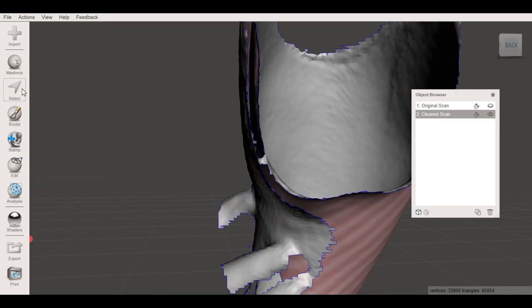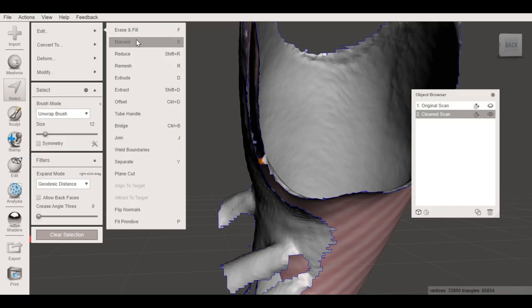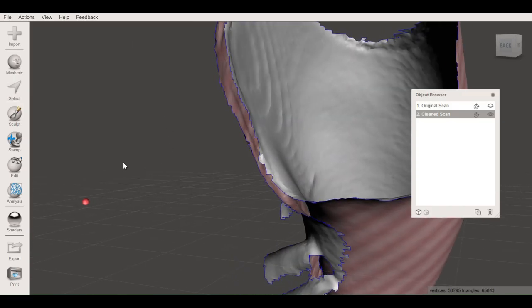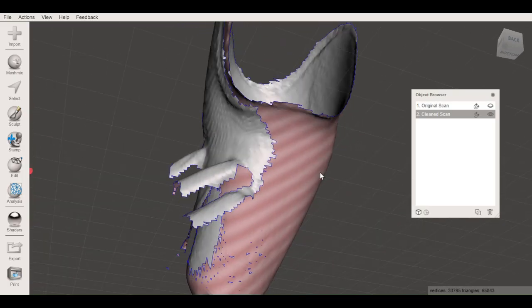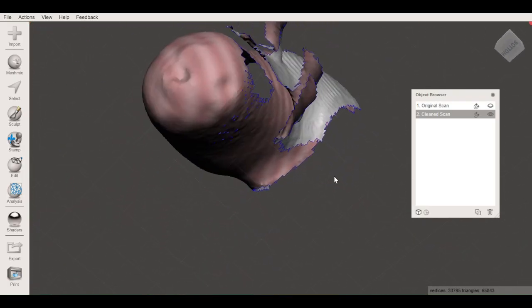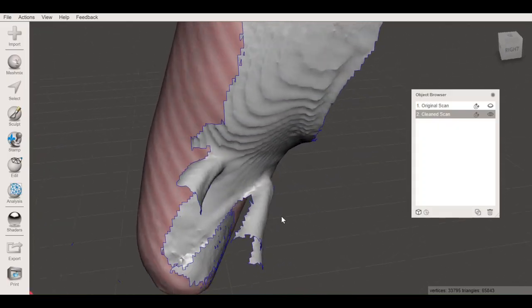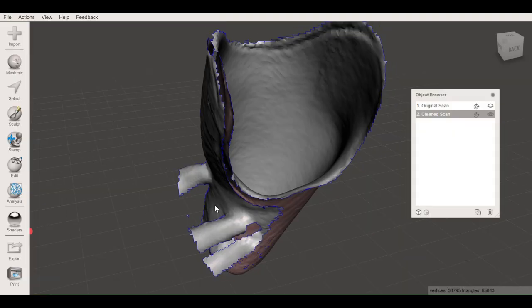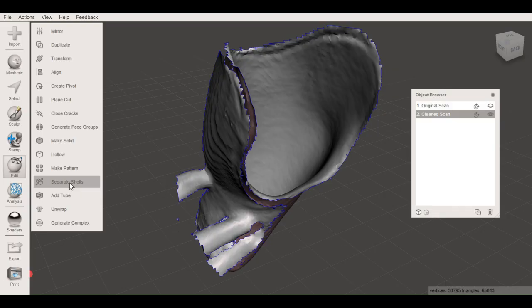So we can select in that region, edit, and discard. Anywhere else we might be connected, let's see. Nope, looks like we are possibly finally disconnected.